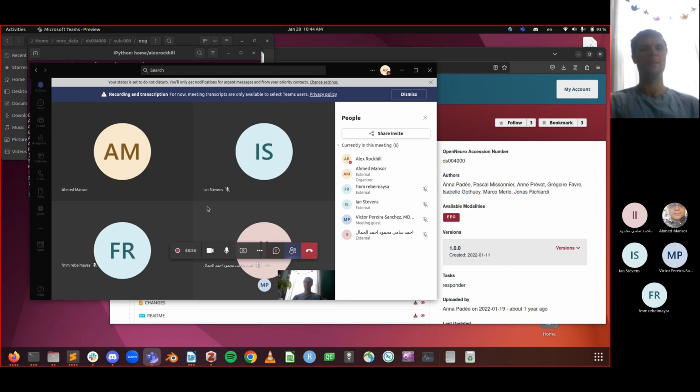That's one method. There's work in MNE to get them saved in EDF or BDF file formats. FIF is another file format, but less work has been done to do lazy loading for those, so they tend to require more RAM. Okay, it's very clear. Thank you. Yeah, so just NumPy for that. I don't think you need anything else.